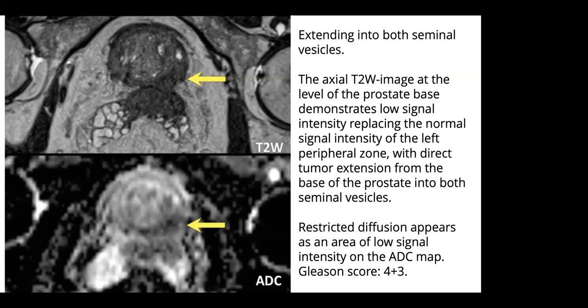Yes, thank you, Dr. Ahmad. So this is selected sections from another case showing local extension. And if we see this yellow arrow is showing a tumor which is extending beyond the prostate. And if you can make out the seminal vesicles, the tubular structures that are slightly lateral to what is appearing hypointense or towards dark gray or blacker shade.